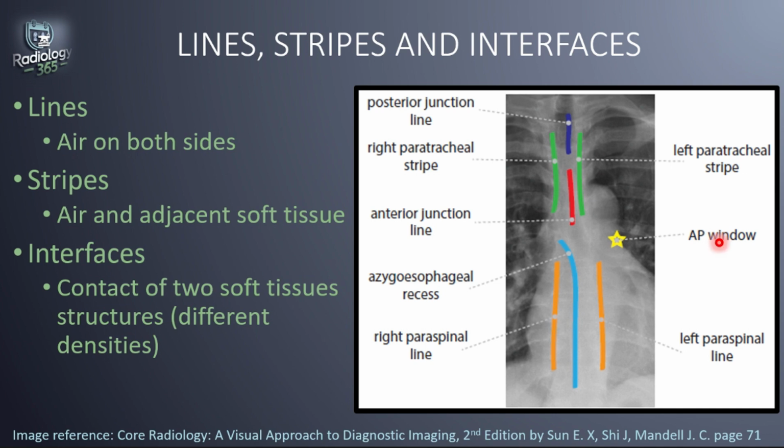The aortopulmonary window is a mediastinal space nestled underneath the aortic arch and the top of the pulmonary artery. The medial border of the aortopulmonary window is formed by the esophagus, the trachea, and the left mainstem bronchus. On a normal frontal radiograph like this one, we would see the AP window has a shallow concave contour below the aortic knob. So this is the aortic knob, and then we have this concave contour here representing the aortopulmonary window. When you have an abnormal convexity, that's an outward bulging of the aortopulmonary window, it suggests a mass arising from or involving structures that normally live within the aortopulmonary window.